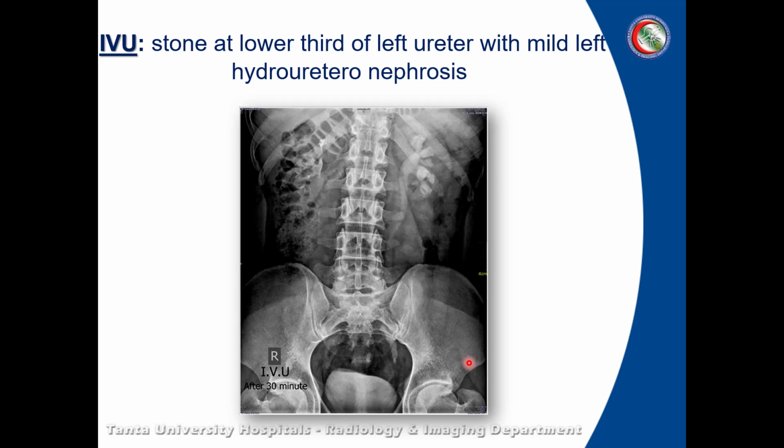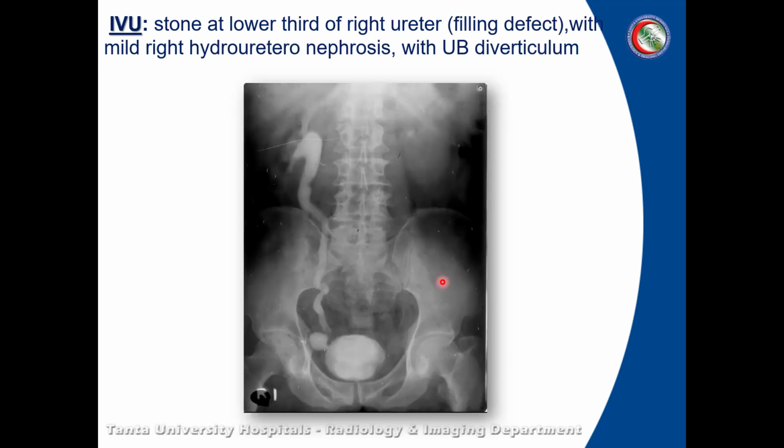Another case, it's IVU also, as we can see contrast excreted. There is a stone seen in the lower third of the left ureter with mild hydroureteronephrosis. Again, IVU.